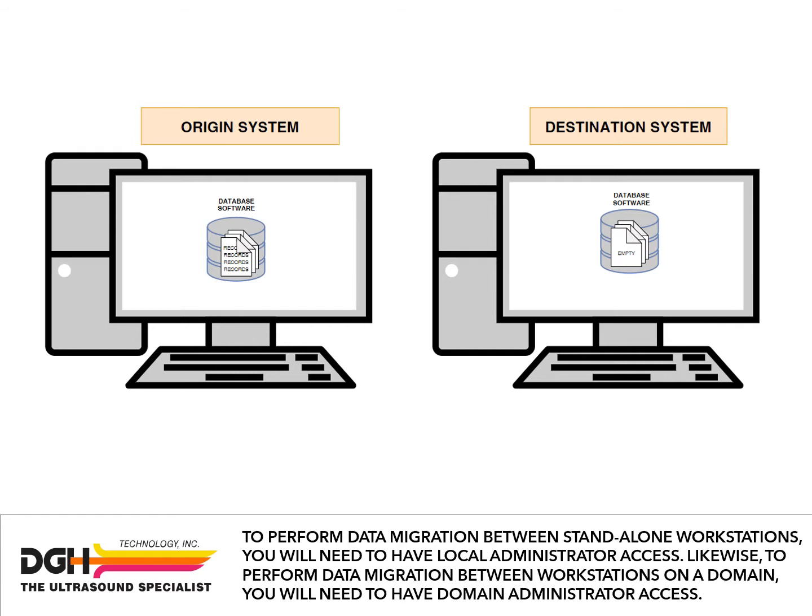To perform data migration between standalone workstations, you will need to have local administrator access. Likewise, to perform data migration between workstations on a domain, you will need to have domain administrator access.